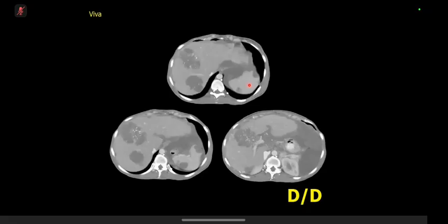Yes, hello, Dr. Han. Can you hear me clearly? Yes, I can. So just give me a bookish differential diagnosis of calcification in the liver. Okay, maybe mucinous tumor metastasis. Maybe fibrolamellar HCC. Maybe hydatid, although this does not look like hydatid. There's nothing else on my mind, but my first differential in this case is mucinous metastasis or pseudomyxoma peritonei even.